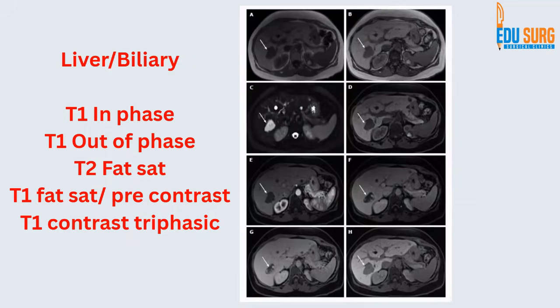So now coming to the most important slide of our presentation, and this is where we started, that we want to identify all these scans. So now, let us see how you can label them. I have not given labels to any of them.